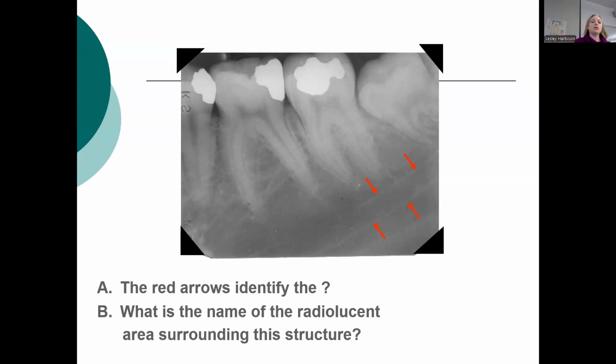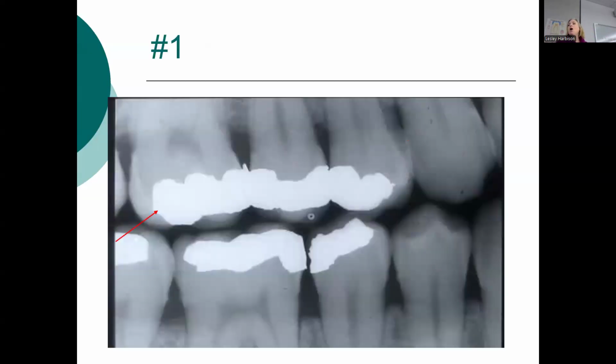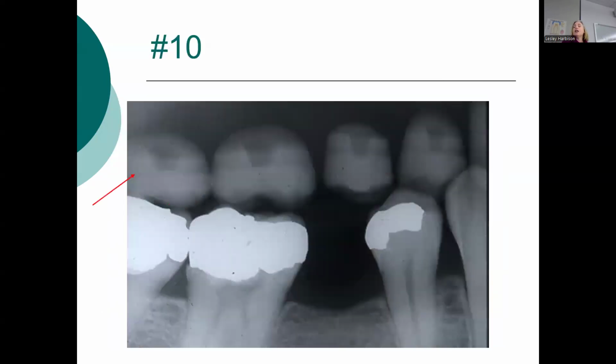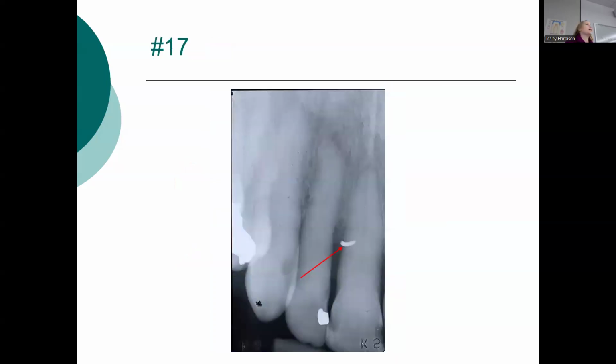And then, okay, we can't do the dental materials game because I haven't talked about that yet. I have about 20 minutes, which is more than enough time. I just have a few slides. Let me run through all of these pictures. All of these pictures are good tests. I do believe I have the PowerPoint with all of the answers. What do you guys think that is?